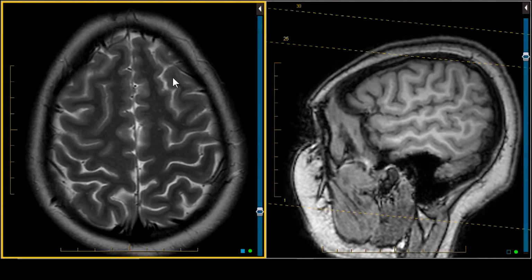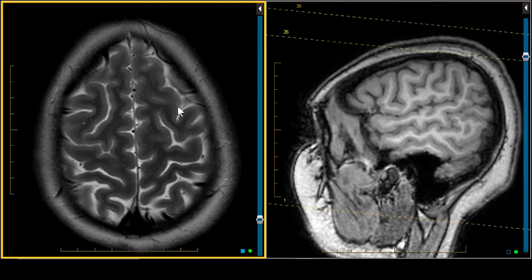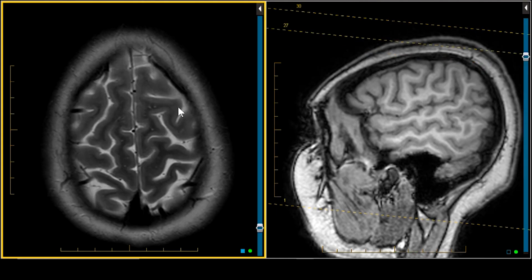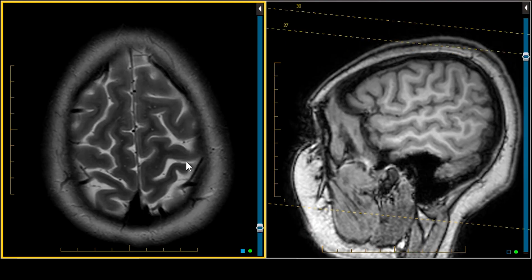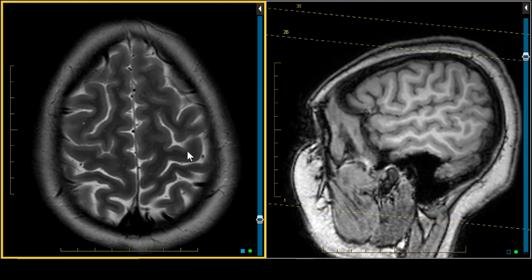Let's follow the superior frontal sulcus back, and we follow it all the way up high, this is part of the superior frontal sulcus, the precentral sulcus. So if we've got the precentral sulcus, we know that's going to be the superior frontal gyrus, middle frontal gyrus, precentral sulcus, precentral gyrus, central sulcus of Rolando, the precentral gyrus bigger than the postcentral gyrus. Behind that is the postcentral sulcus.